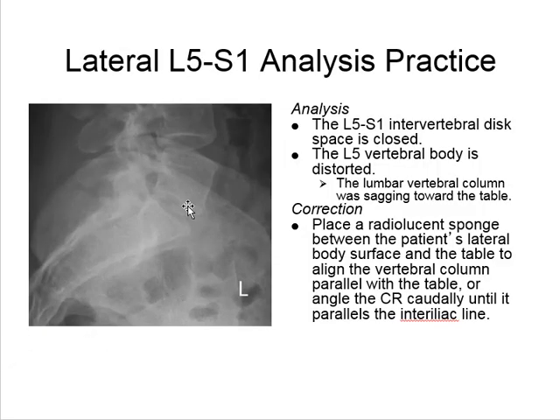So we see here that we've got separation between the iliac crests, and this is what I was talking about with coplanar. The vertebra is not lateral. You can see the bottom of this L4 here. You can see the bottom of L5 there. So that's not coplanar. What we would need to do is angle the central ray or build the patient's L-spine up a little bit.